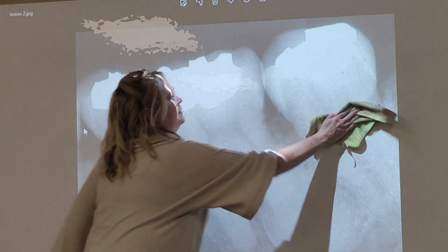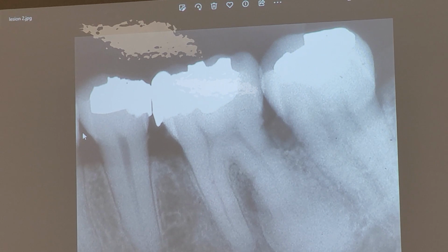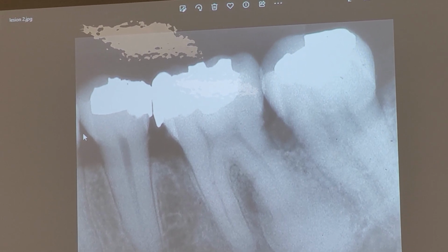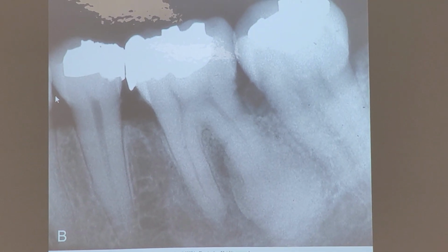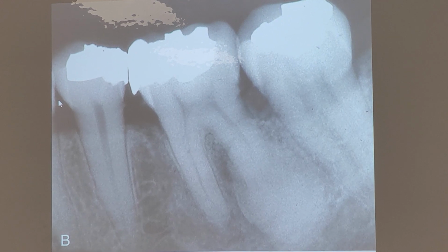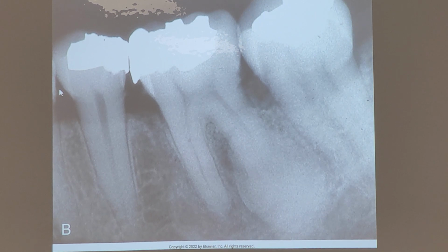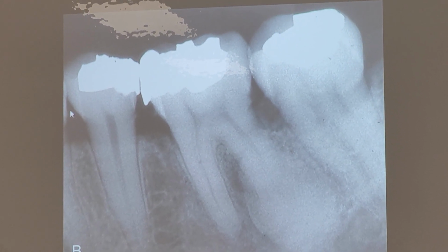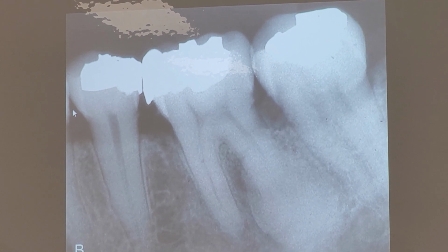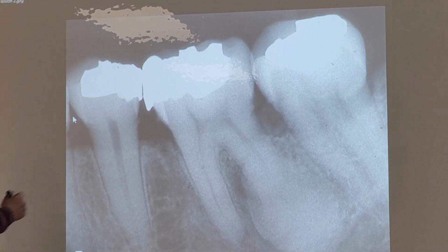Somebody from this row who wants to try to describe this lesion for me? This row here. You guys got saved. Okay, so restorations. Who's going first? Here's number 20. Number 20. Yep. And just write on it. Just write right over the top of it. What is it?